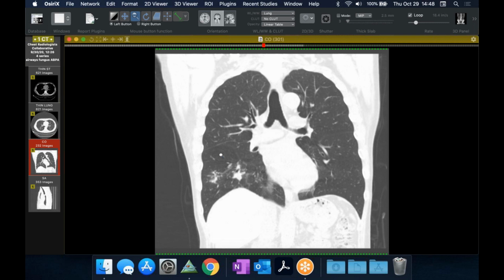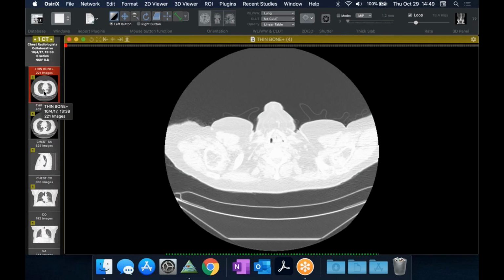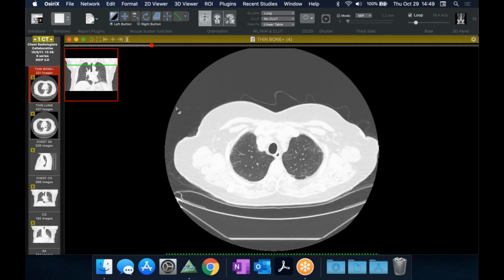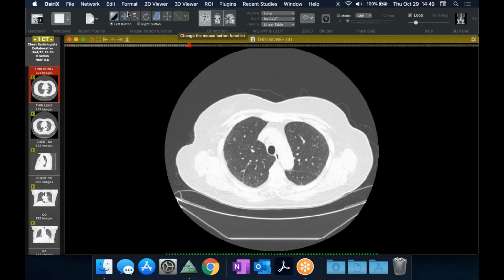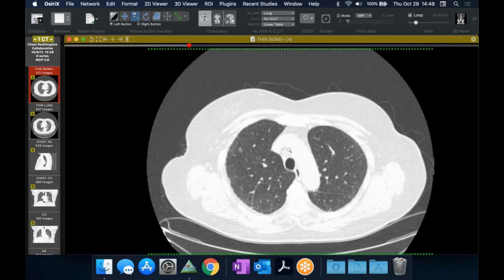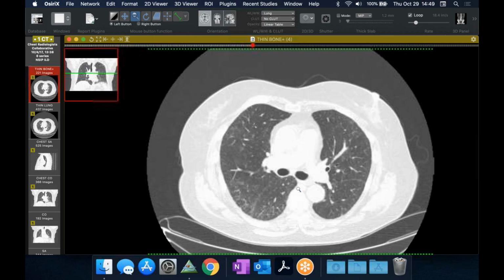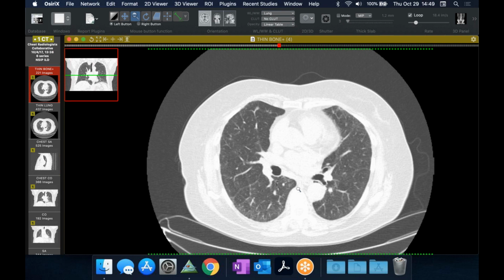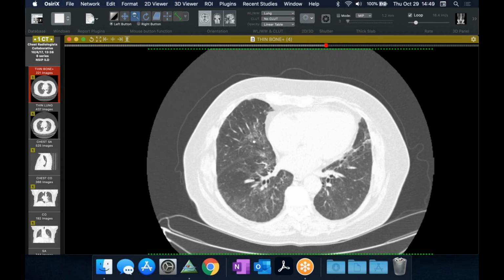And I think it's a great look for ABPA as far as the dense mucus goes, but it's absolutely the wrong distribution. It's very lower lung predominant, and there's really not much bronchiectasis. There's a little bit there and there, but not like we typically see where it's more varicose. But he had elevated IgE in his blood, which of course correlates nicely with the activity of this. So the consensus diagnosis is this is ABPA, but it's just in a very strange distribution. And I think it was a delayed diagnosis because of the confounder of the digging around in Arizona, not Coxey.